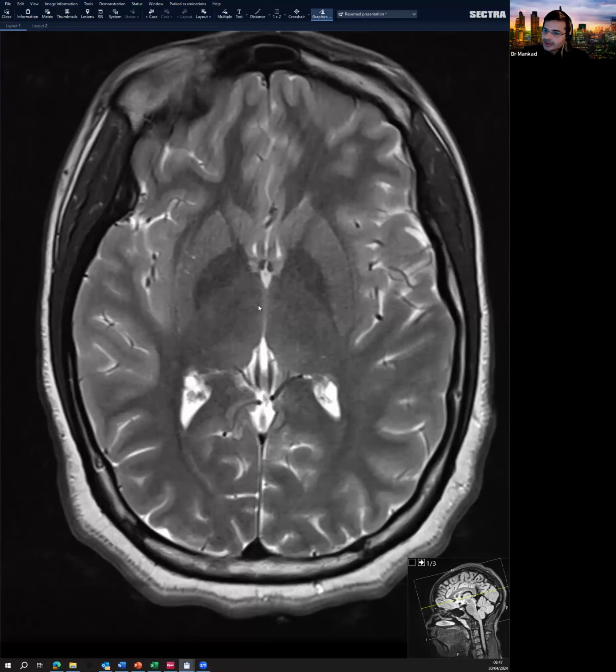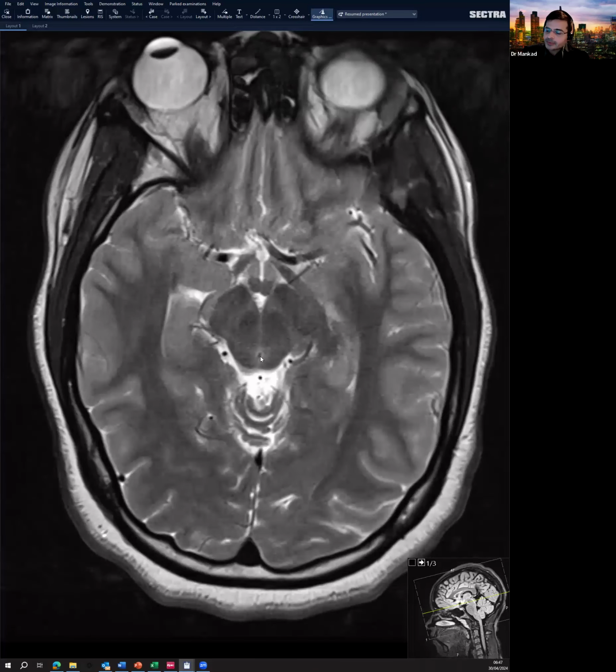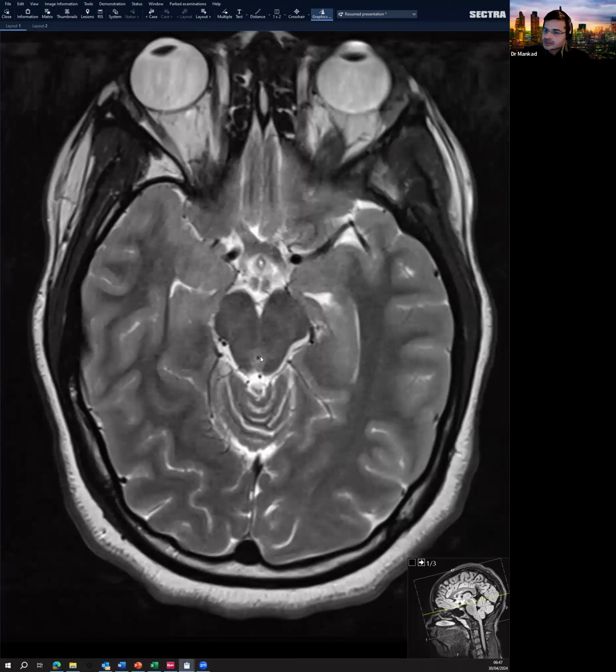So we looked at the basal ganglia, the thalami, the ventricles, and some of the lobar separations using some clear demarcations. Here we are at a lower structure. This is the midbrain, and these are the crura of the midbrain. You've got the left cerebral peduncle, the right cerebral peduncle, and arranged around the midbrain area are the amygdala and the hippocampus.